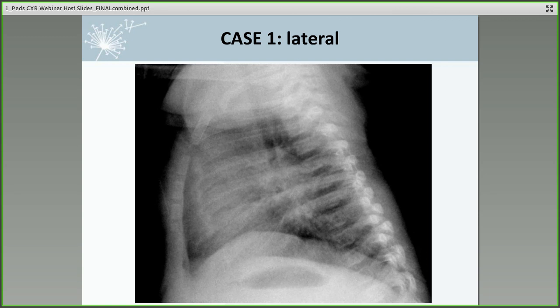Great. Thank you, Ann. Okay, so the baby lateral view. Now let's review the anatomy again. So you have the trachea coming down. Now you don't see the right upper bronchus very well. The right PA is also not well seen, and the left PA is definitely not seen. And in addition, you see increased density throughout this region of the hilum, consistent with adenopathy.